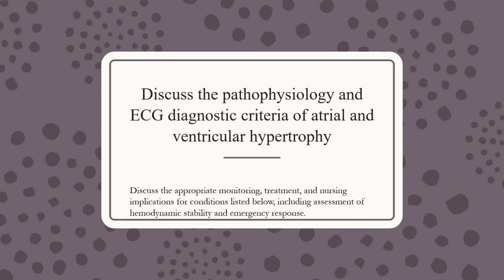We start off by looking at 1 and 3, or it could even be 1 and aVF, it doesn't really matter. And then if we have a left axis deviation, we look at lead 2 to determine if it is pathologic or not. Okay? And so if you can memorize the leads that you're supposed to look at, then the rest of this kind of falls into place.